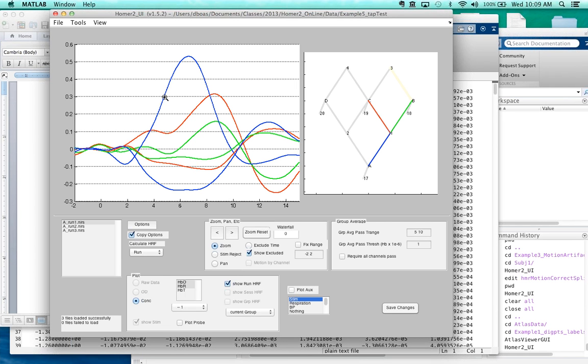Just clicking on that will export exactly what is shown in that plot, just so you have the numbers. Yes. And so if you were using Homer, it's good for visualizing, and then you want to actually do some statistical tests or something like that. Do you use that, or is there anything else that you use? So you can export session results here, run results, group results, and then you can bring it into your own favorite statistical analysis package to do your analyses.